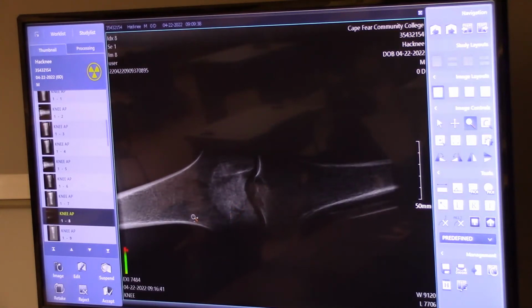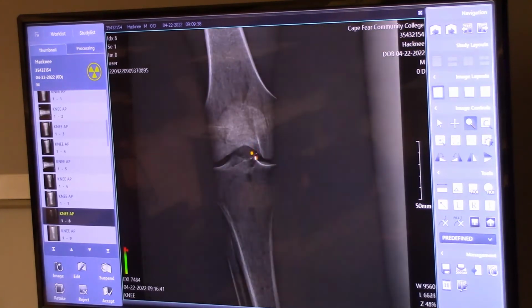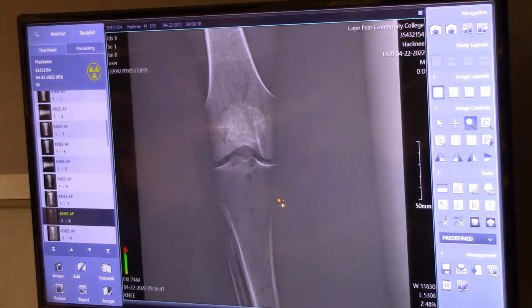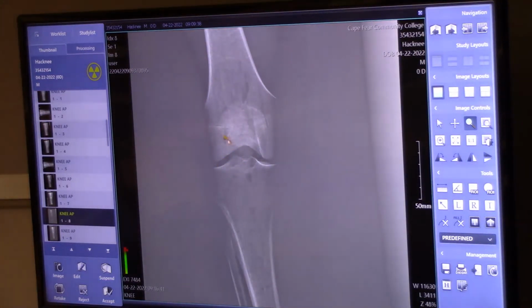Okay. Just took a bite out of there. Okay, so this one has an exposure of 7484. So that, yeah, this is number 7. We burnt out the 7, so we can't see the number. We also burn out the patient's knee. Medial and lateral aspects are gone. So, yeah, see, we fried that so hard that the computer can't window width and level it anymore. She's scorched. Big time.